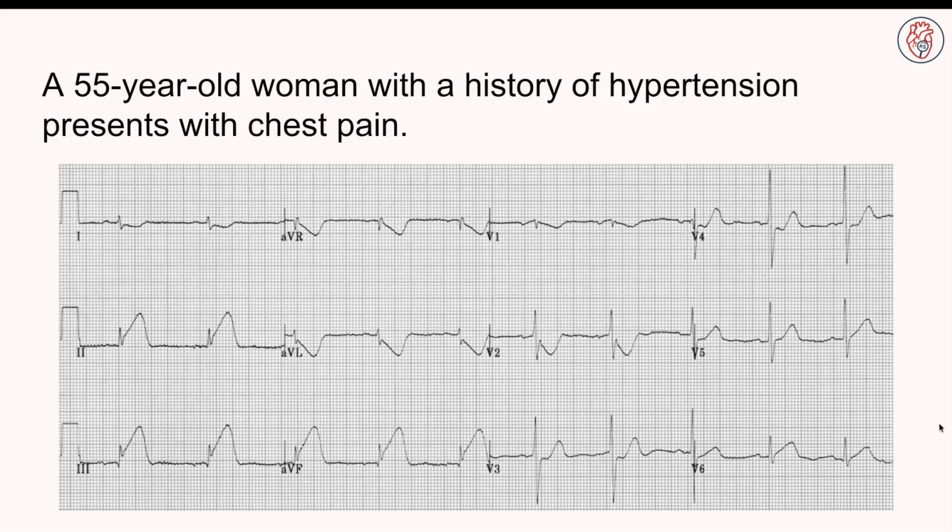Now, when we talk about a sinus rhythm, you can have a sinus rhythm and you can have a STEMI at the same time. They're different issues. A STEMI is related to our ischemia and infarction, and a sinus rhythm just means that you have this electrical signal that starts from the SA node. And we know that because we have P waves. If we didn't have a P wave, we wouldn't have a sinus rhythm. But we have a P wave, so they have a sinus rhythm, but they still have a STEMI.